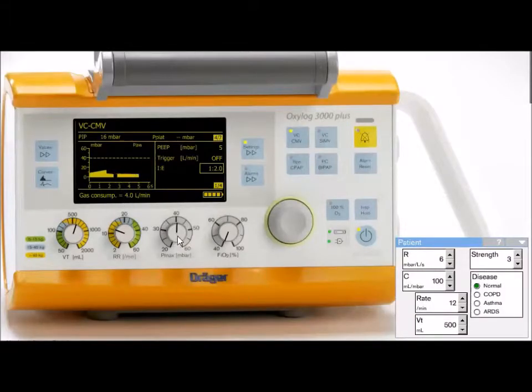This is my Oxylog simulator, and let's see what happens when I change my PMax. I'm going to change it from 40 to 30, and we'll look at the measured breath output and the waveforms. As you notice, the PMax line, my pressure limited line, went down. Now I'm going to change my patient to make it an asthma patient. As you notice, I have an alarm setting, and my breath pattern changed, it squared off, so it changed to a pressure control breath. It didn't prematurely end the breath, it just changed the breathing pattern.